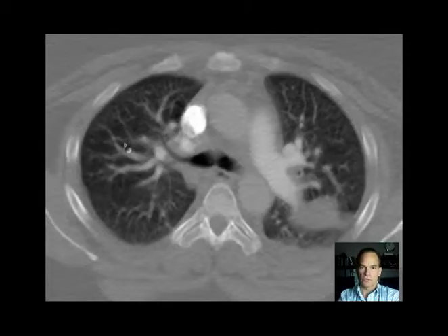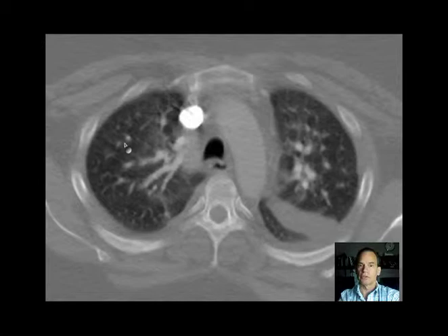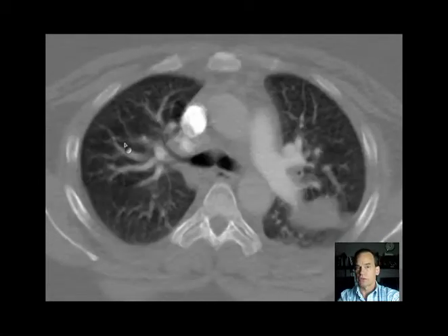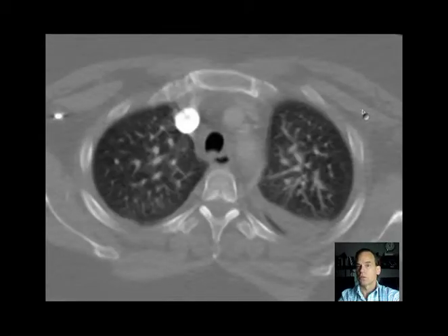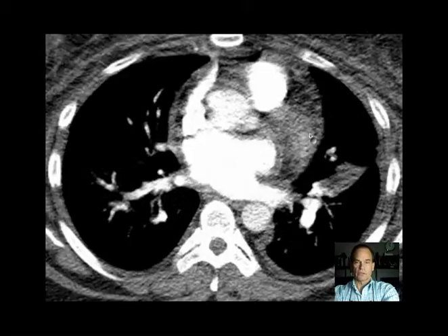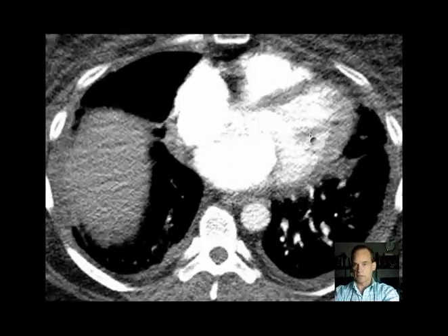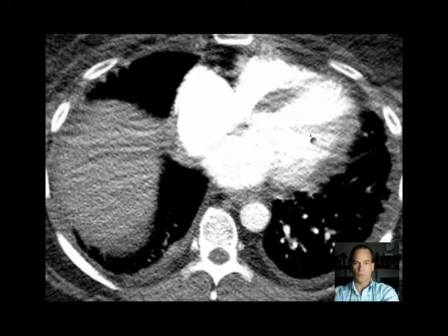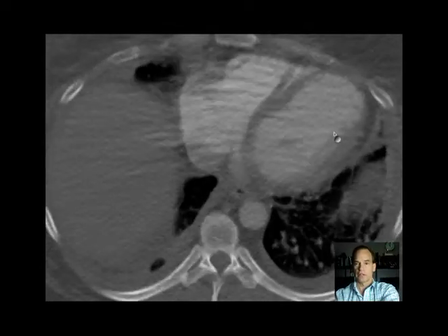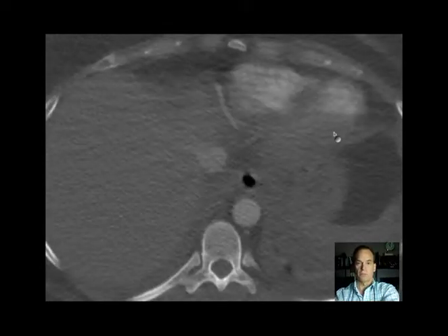So what you're seeing here is what we call pulmonary vascular redistribution, and we see it on chest radiographs, but here you can just see that there are prominent upper lobe vessels bilaterally. The heart doesn't look particularly enlarged, and it doesn't have to be, but it is big, it's abnormal, but you can get congestive failure in a patient with a normal size heart. For example, if they have an acute heart attack, they can come in with failure.